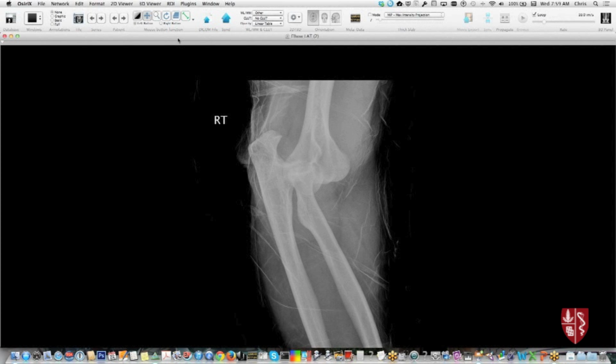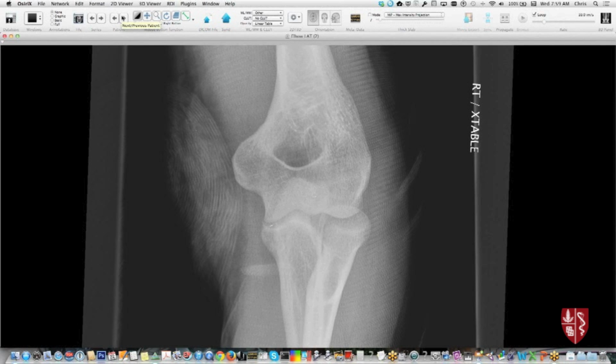but the thing to keep in mind is that the bones may not be that abnormal in the sense of the ulna and the radius here are still pretty much intact without major fractures. What you may see fracture of is the coronoid process, as you can see through here. Looks pretty normal, but it can shear off because most of these dislocations are posterior directed dislocation of the ulna relative to the humerus. Here's relocation in that same patient. You can see the bony anatomy is actually intact.